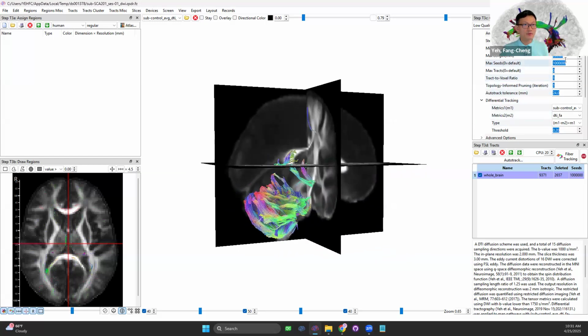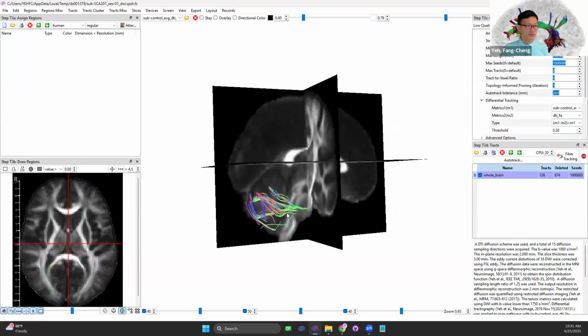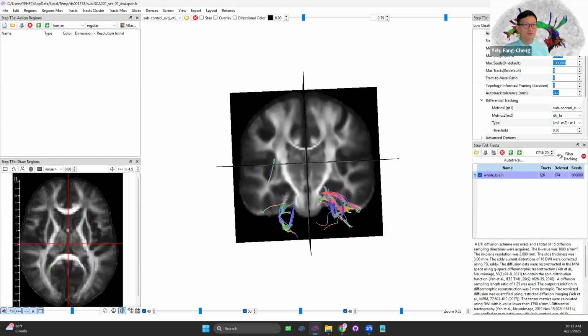Of course, we could get more specific results by increasing the length, or increasing the difference threshold from 20% to 30% decrease compared to the control. Then you will get more specific results. Those two parameters control the sensitivity of the finding.